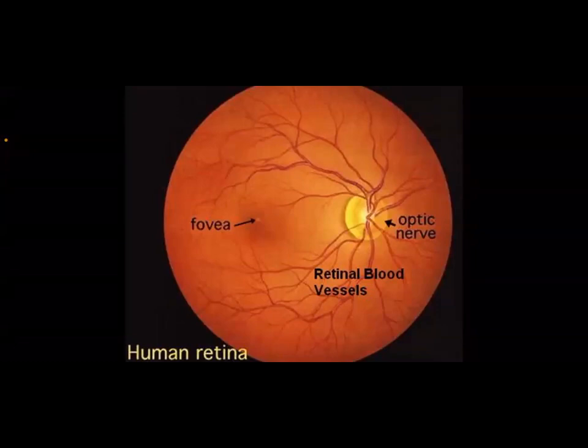So if you can see, it is written optic nerve, right? And there is an arrow. This side is the nasal side, or the medial side. The patient's nose is behind this optic nerve, behind this word. So this area is blurry, and the other side is shiny, well demarcated. If you see an optic disc where even the nasal side is well demarcated and shiny, just like a moon, like a light, like a lamp.